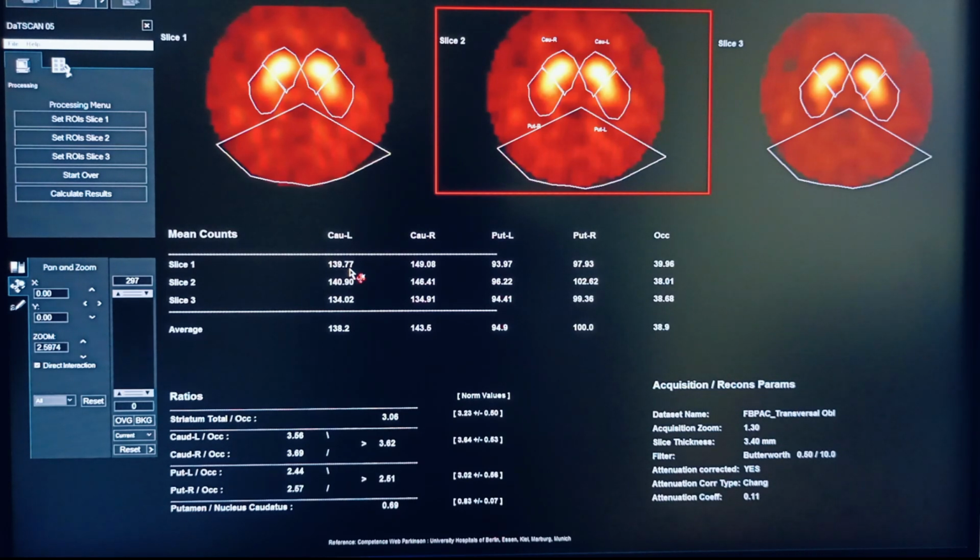So this processing does not require CT data for attenuation correction. One is the Chang method correction. Yes, this application accepts the Chang method correction because brain is mostly uniform. So there is not much difference between the CT based attenuation correction and the Chang method. So most of the time you will not see any difference whether it is CT based or Chang based.